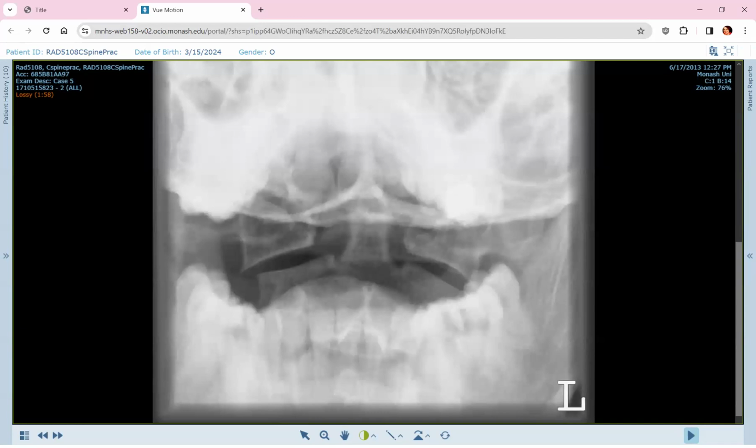However, on the right side, if we draw a line, we can see that the lateral mass of C1 is overhanging the lateral mass of C2. And also when we look at the lateral margins of the odontoid, we can see that the distances are unequal. And this is in keeping with a Jefferson's fracture.